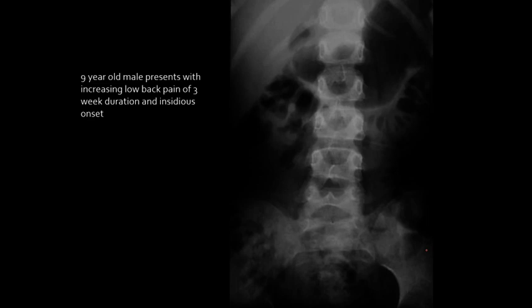All right, 9-year-old male presents with increasing low back pain, 3 weeks duration, insidious onset. This image here doesn't show very much. We have a lot of bowel gas. I don't see the margins here, so this is an area I would want to further image. We do have some bowel gas crossing that, but it should still be visible. So the right SI joint and ilium is the area I'm mainly concerned with in this individual. I want to get a spot shot there.